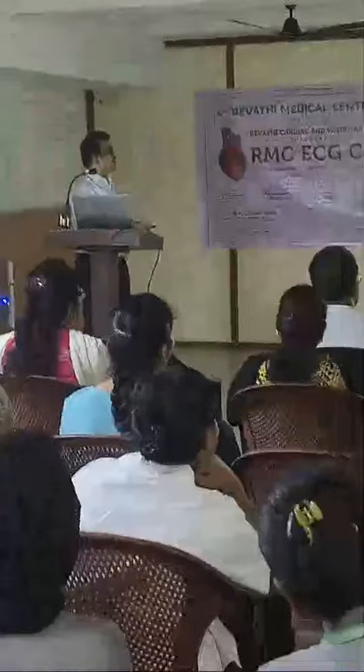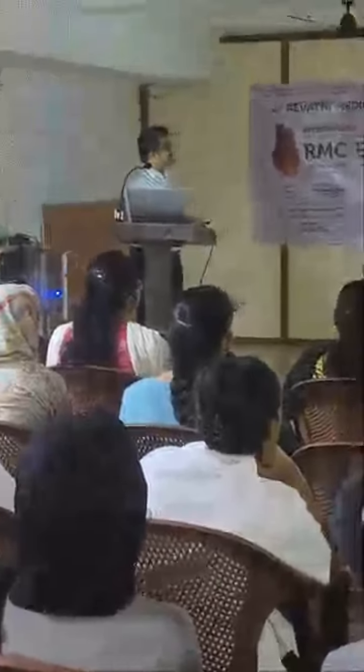So you can see we have a deep S wave, and you can have a Q wave and T wave inversion. Along with that, you have signs of RV strain, where you have T wave inversions, incomplete right bundle branch block, and late transition, such as you have RV dominance. So these can all clinch your diagnosis of a pulmonary thromboembolism in a clinically suspected patient.